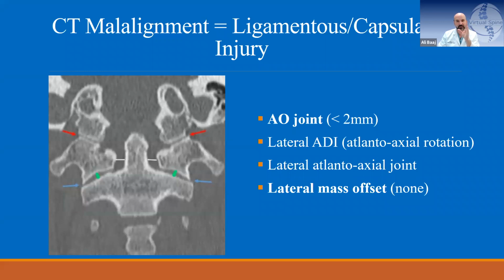You see the dens toward one side, one lateral mass more than the other. It's tough to tell whether they were born like that. Is this a chronic, non-pathologic asymmetry, or is it really something to worry about?